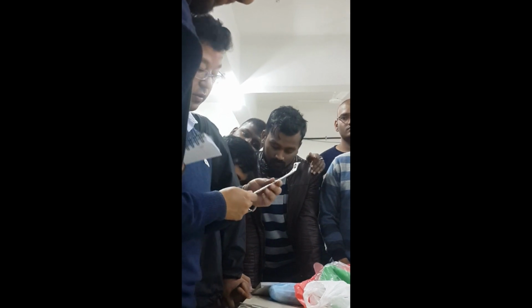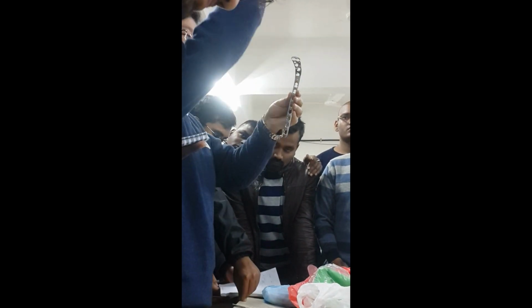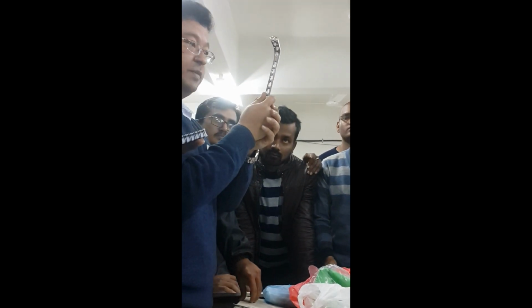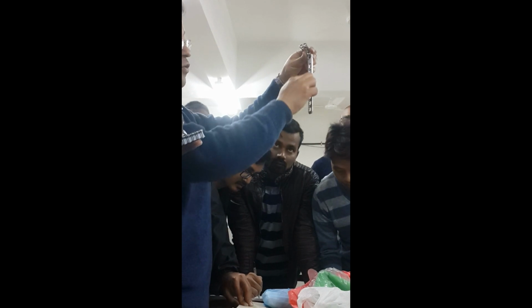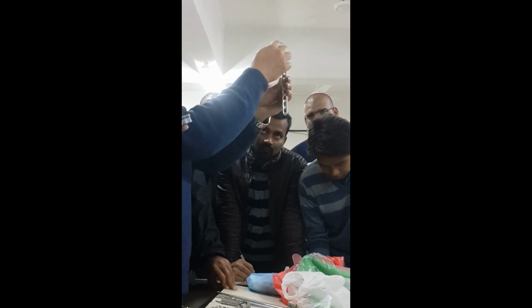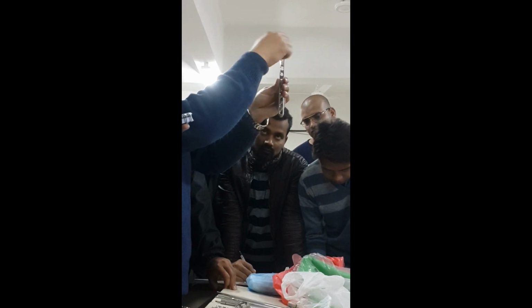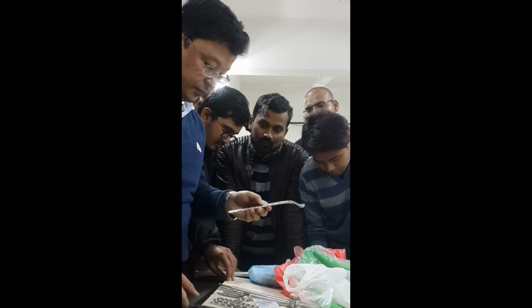Let's see. And this is straight and it comes like this. This is a proximal tibial locking plate for tibial plateau fracture. Okay, same thing. It has the combination hole, and the holes for the K wire. And here in the metaphyseal area you only have the locking holes. Okay. And in this there is one more thing.